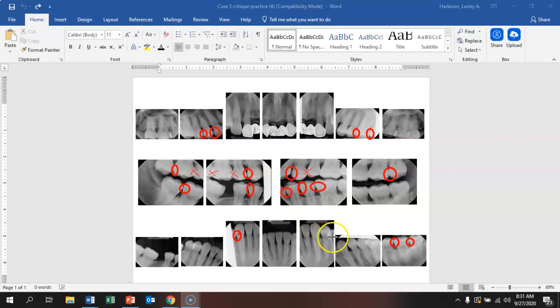Okay, so that's what you do with your contacts, is you basically go through your bite wings first because that's your most likely place, and then you look through your other films, look through your PAs to see where you were able to open contacts just serendipitously when you were taking your PA.